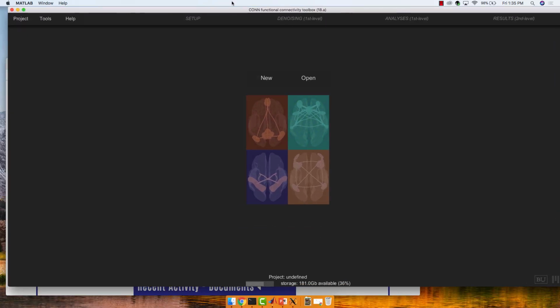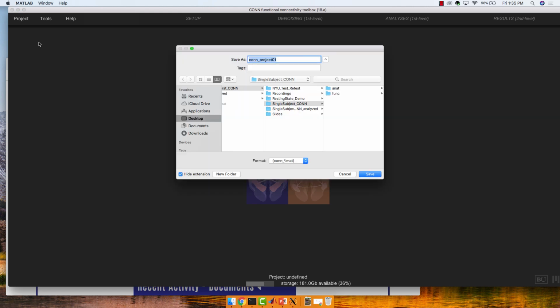Okay. I guess go to Project. Project, New blank. Okay, it didn't like clicking on New for some reason.